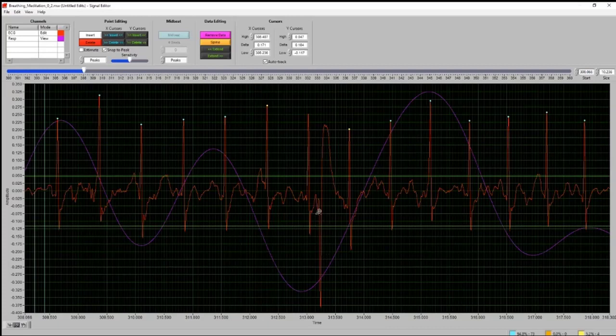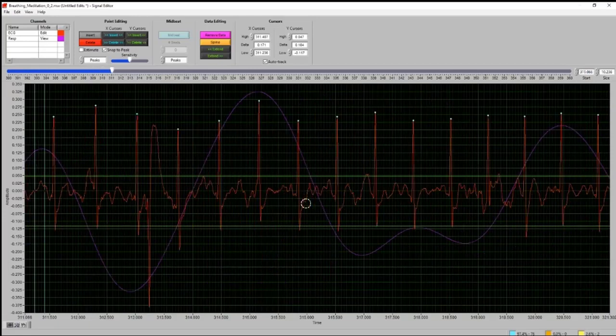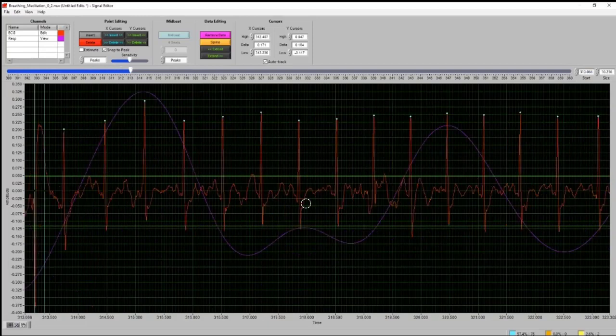And then once again, you'll get really used to seeing this. It looks like there was a motion artifact. So because of this motion artifact, the beat really wasn't being detected. We can hit the insert beats. It will come up with this circle. We place the maxima, the R peak, within that circle, and then it will automatically place it there for us. So pretty simple procedure there, if the software ever makes a mistake on that, usually because of motion artifact.